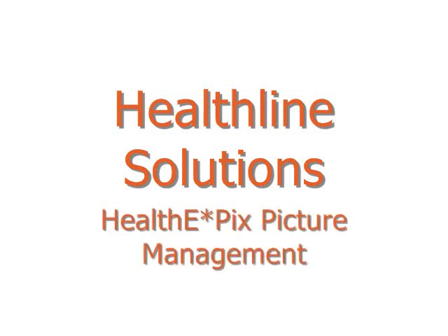HealthEPix is a workflow-based application that allows you to import, classify, annotate, and archive image data from practically any source. When you use HealthEPix, you can eliminate the shoebox method of picture filing in favor of a centralized, secure, indexed data store that can be integrated with your hospital or practice management system.